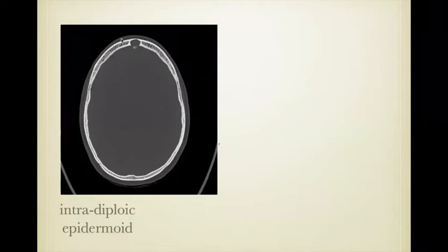Metastatic lesions tend not to be sclerotic on the margins because they're, again, rapidly growing usually, and they tend to destroy bone along the front edge. So this lesion we would characterize as probably benign in the sense that we have remodeling of bone, and rather than destruction of the inner table of the skull, we have displacement of the inner table of the skull. Again, MR scan, very helpful.